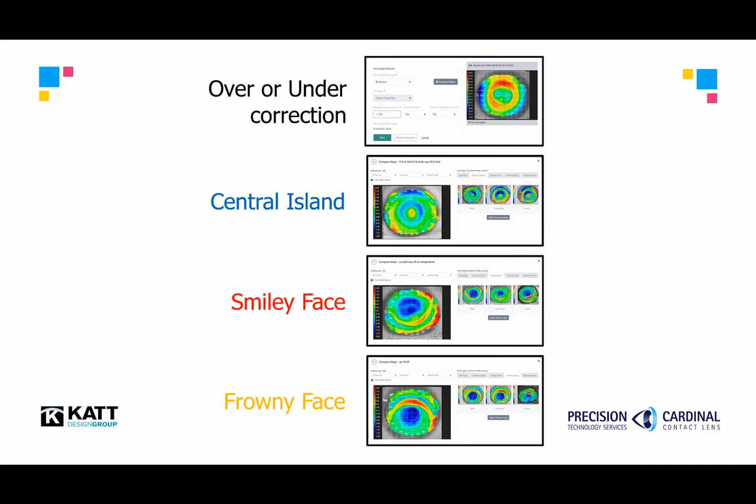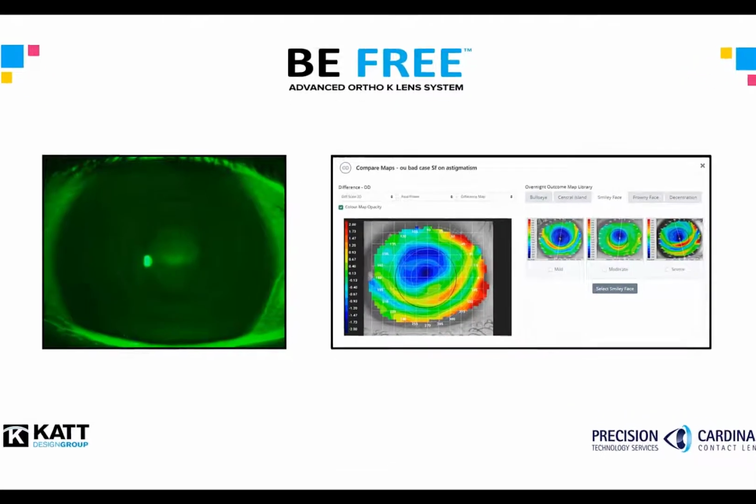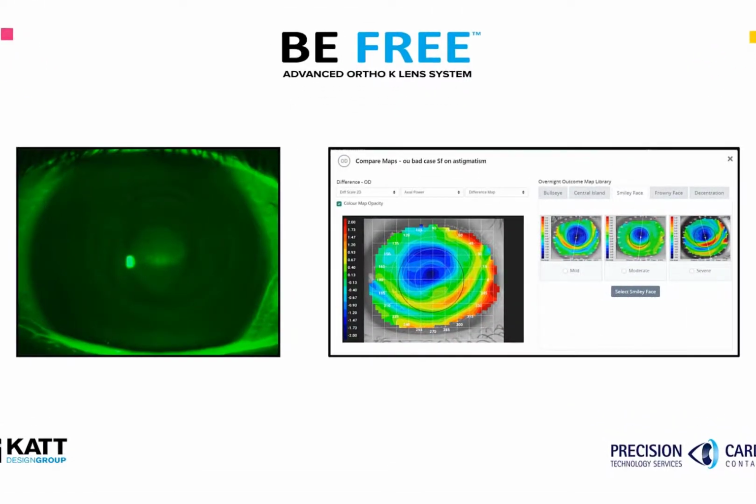However, these same outcome descriptions and the associated modifications created by the software can also be used to resolve other findings. For instance, a lens that is bearing on the central cornea and creating persistent apical staining can be resolved with the smiley face response.